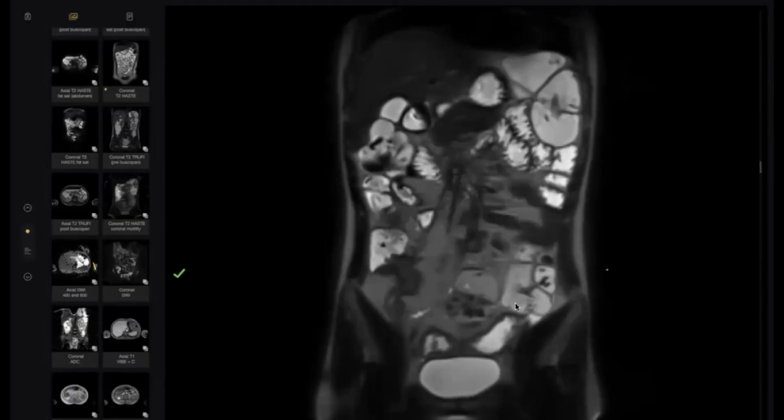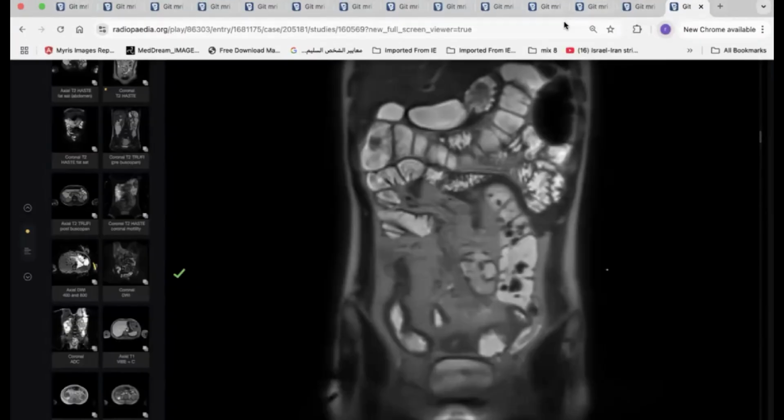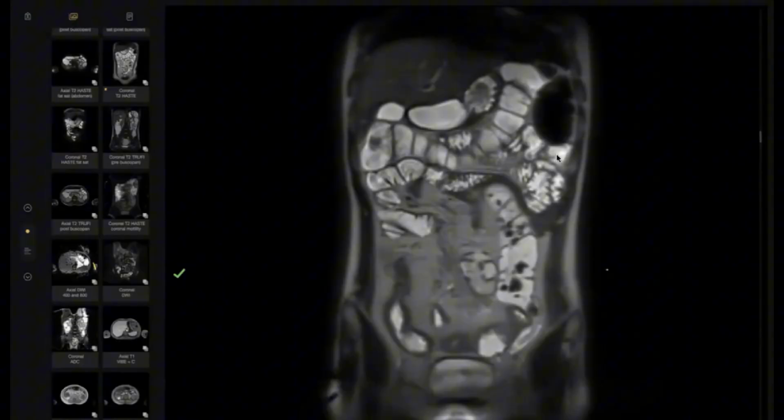So conclude, doctor. This is fibrostenotic Crohn disease in the active phase, resulting in multiple fistula formation and engorged vessels. So I will refer the case to the gastroenterology team for further management and follow-up. Do you know the most recent imaging classification for Crohn's, other than active or chronic or non-active?